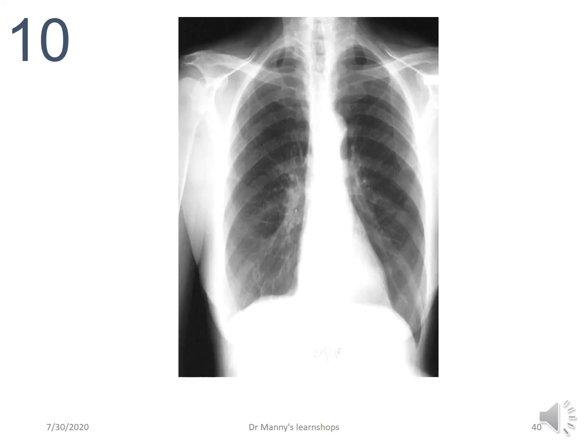And last, but by certainly no means least, we look at this chest X-ray. Hyperinflated lungs, elongated shadow, and if we eliminated the fact that again it's probably been maybe underpenetrated, we can still see the vascular markings throughout the lung fields. We can see the ribs, the intercostal spaces. We can see the elongated shadow, the flattened hemidiaphragms. This would probably be an example of a classic chest X-ray for a chronic obstructive pulmonary disease patient.